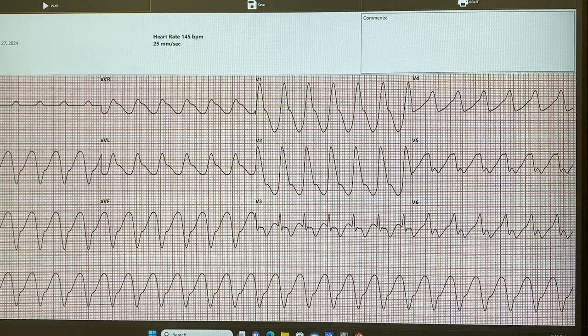Okay, go through the motions. What's the next thing we'll look at? We're looking at the presence of a P wave. Is there one? No. So therefore there's no PR either, right? No P, no PR. And we know there's no 1 P for every QRS because there's no P, so we're skipping all that. Okay, next we're looking at the QRS complex. We have a widened QRS complex here. How wide? Let's count. And I'm counting from the base, correct? Okay.